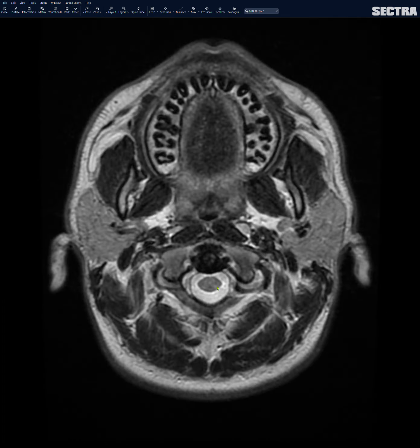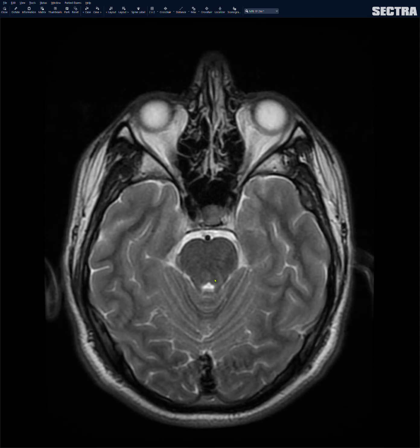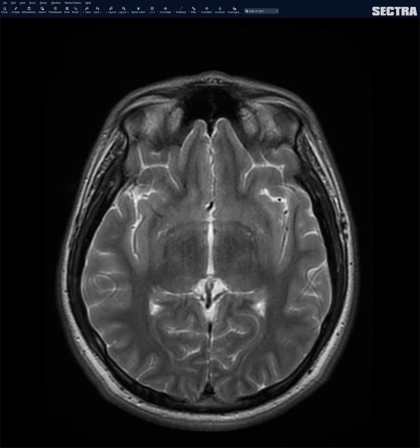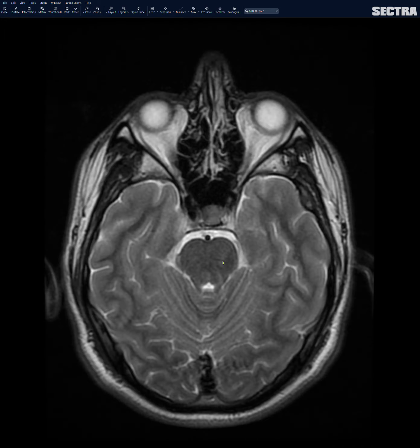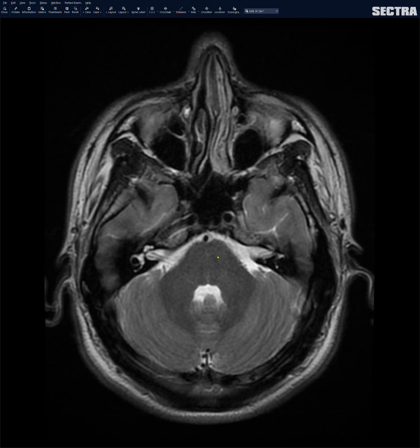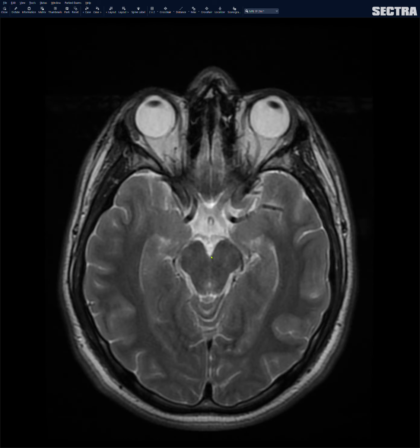I look at the medulla. I work my way up to the pons. I work my way up to the midbrain. Okay, look for any kind of signal abnormality, especially anything that's T2 bright. Sometimes you can catch a little lacunar infarct in the pons, or chronic white matter change within the pons.